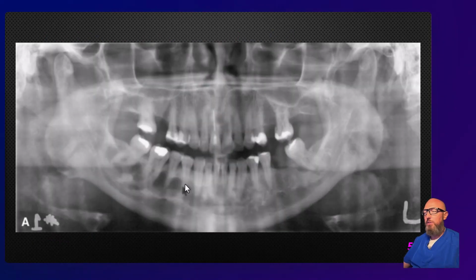This one's a little bit more cystic. If they biopsied this, it would probably end up being a simple bone cyst, or that's what the histology might come back as. But you want to try to avoid biopsying these because there's less vascularization, they're more prone to infection. So these are a really important one to be able to recognize radiographically and say, hey, this is a no-touch lesion, meaning we don't want to operate unless absolutely necessary.